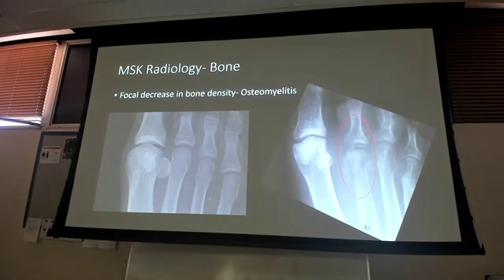So what type of patient do we think this one is? Again, normal on the left, abnormal on the right. First of all, what body part is this? That's a foot. What's this thing sitting on the edge here? Anybody know? Yeah, you guys already know sesamoid bones. Good. Sesamoid, that is not an abnormality. Sesamoid bones are normal. We'll talk about some of those variants later.